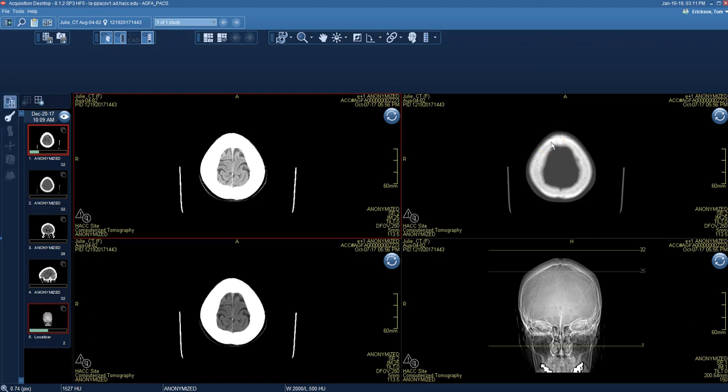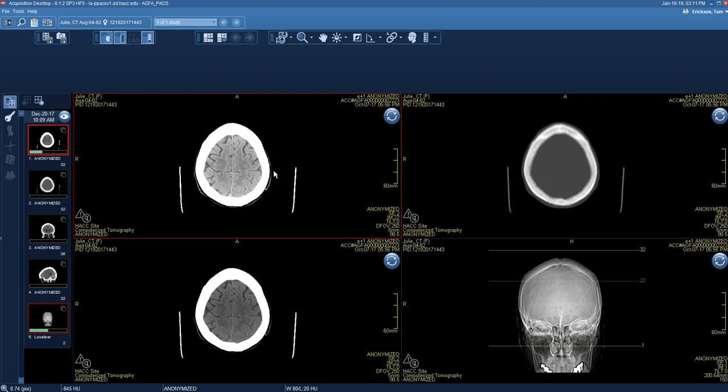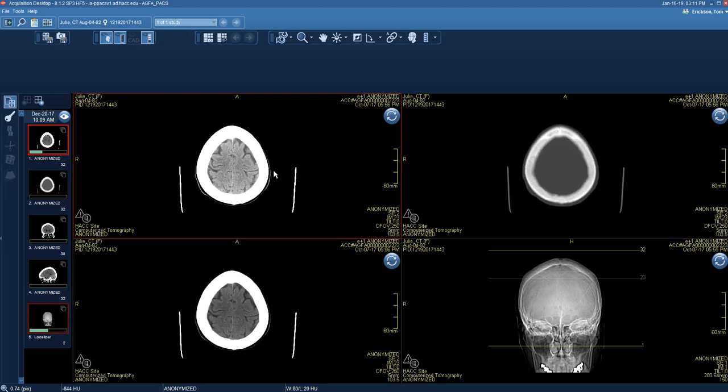So when you're looking at CT studies, you'll need to know your body planes. These are axial images of the CT of the brain, and this is one scan. So they didn't have to scan them 2 different times to get these different type of windows. This is what reconstruction or reformatting does. They scan the patient one time, and then they can create the presentation state of the images using that initial data set to make these different types of images.